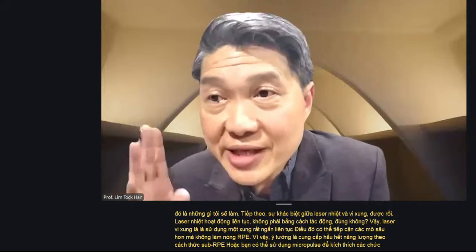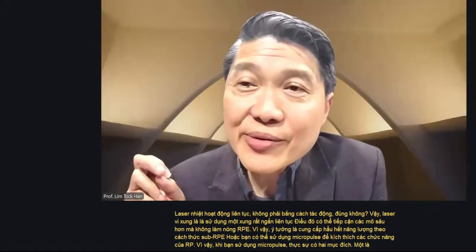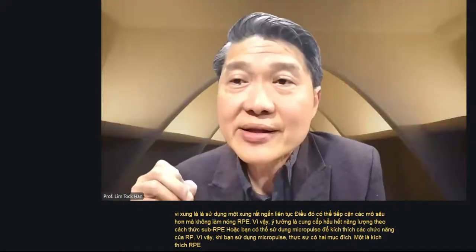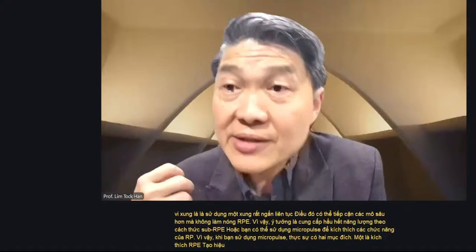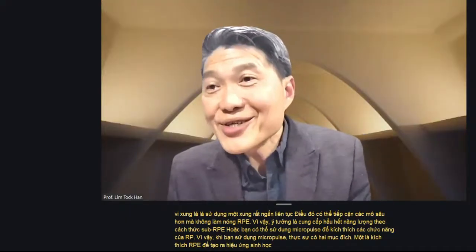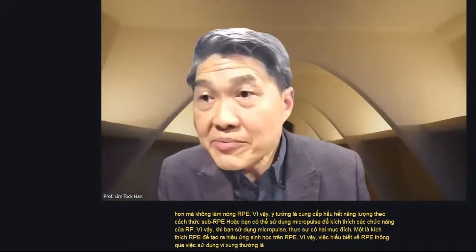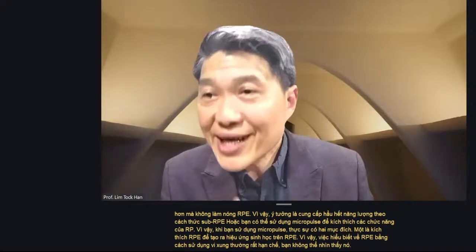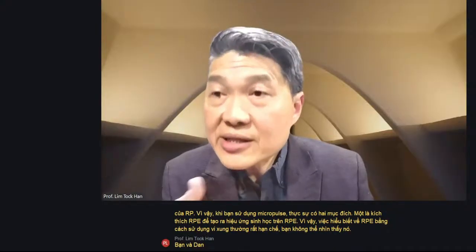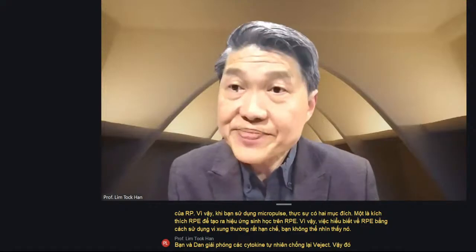So when you use micropulse, there are actually two aims. One is to tickle the RPE to create the bio effect on the RPE. You tickle the RPE using micropulse, usually it's sub-threshold, you don't see a burn. You would then release cytokines that are by nature anti-VEGF. So that's one way of using micropulse.